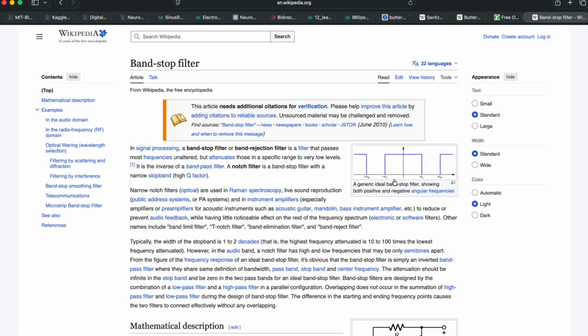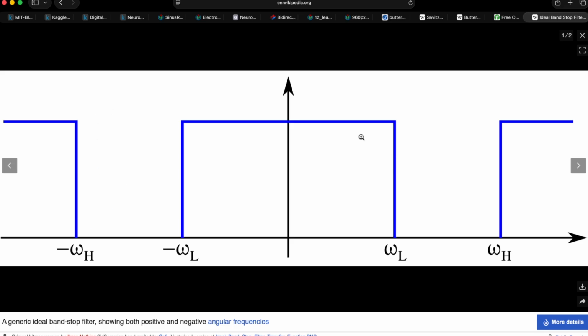When it comes to frequency filters, ideally we would be able to say, if we're just looking at a signal, this is high frequency on the right, low frequency on the left, we want to be able to say, okay, I only want these frequencies and I want it to stop at exactly 500 hertz or something, or I only want everything exactly higher than 650 hertz and the like. Math does not work that way.